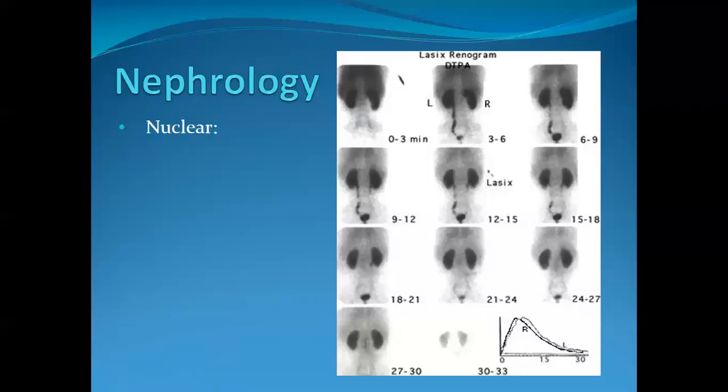Most often what we'll do is we'll have an individual with a dilated collecting system, possibly a younger or middle-aged person, that's been read as hydronephrosis. So the collecting system's dilated, like you can see here in this left kidney. You can see the collecting system dilated compared to the right, and the ureter dilated. And they'll call this hydronephrosis, but we can't see anything obstructing it. So we don't know if it's actually obstructed, or if it's just dilated or ectatic.